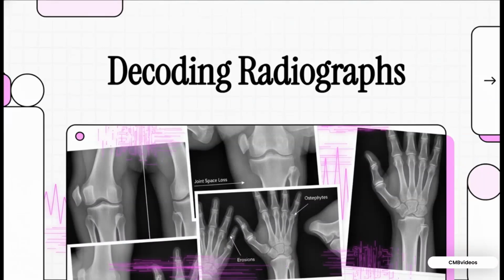Welcome to this explainer. Today we're stepping directly into the reading room. Our main focus? We're going to discuss the precise indications for plain radiographs of joints and really dig in to describe the characteristic radiographic findings of some of the most common articular disorders. Whether you're assessing a patient in the clinic or reviewing films on the wards, interpreting joint x-rays is an absolutely fundamental skill, and today we're going to master it together.